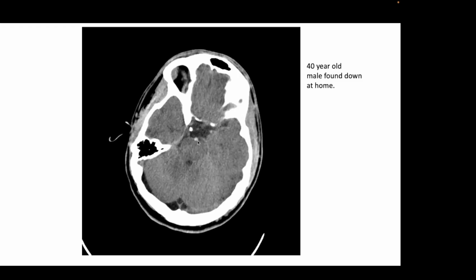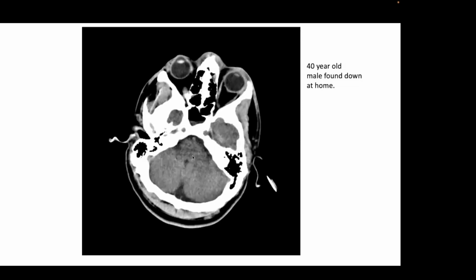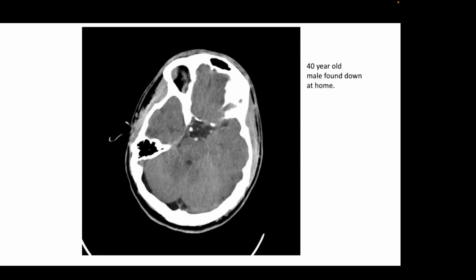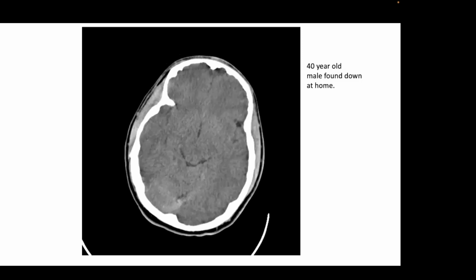Now, this can be misleading in some older patients where you can have calcifications that, because of volume averaging, can masquerade in this way. But when you see it in a clinical circumstance like this, then I think you're most likely dealing with a basilar occlusion. And again, notice the way that attenuation changes as you go cephalad. The idea is that as the clot retracts, the attenuation goes up, so it has a higher attenuation than intravascular flowing blood that you see elsewhere. Excellent, very good. So this is the dreaded basilar occlusion.